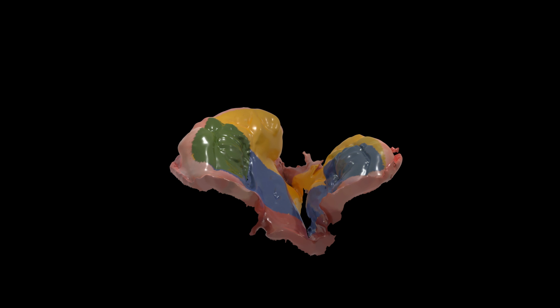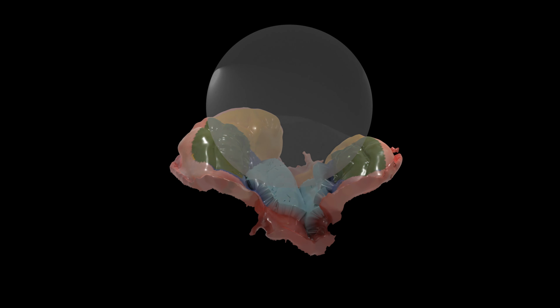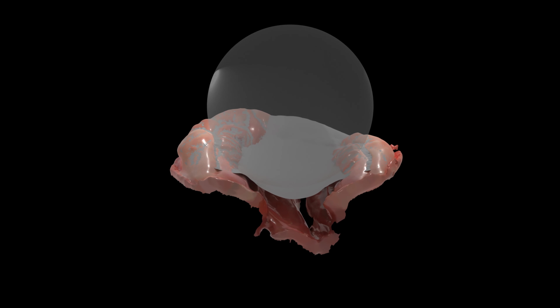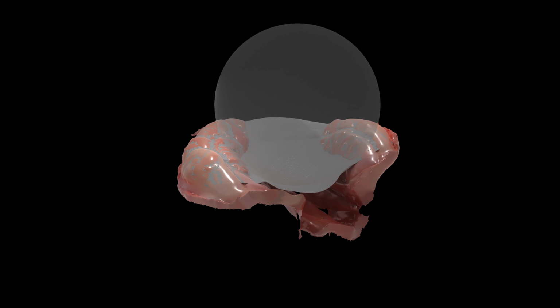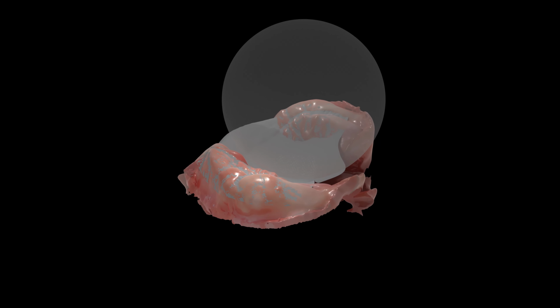To ensure a smooth connection between the alveolar segments, the sphere is forced to touch both regions marked in green. The points in light blue are offset by 2.5 mm to keep a safety distance from the cleft tissue. We then bridge over the palatal cleft region for the plate by applying Laplacian smoothing. The resulting surface follows the sphere and thus imitates a healthy palatal shape.